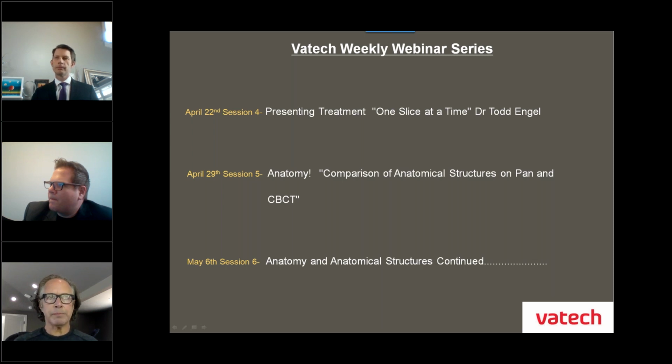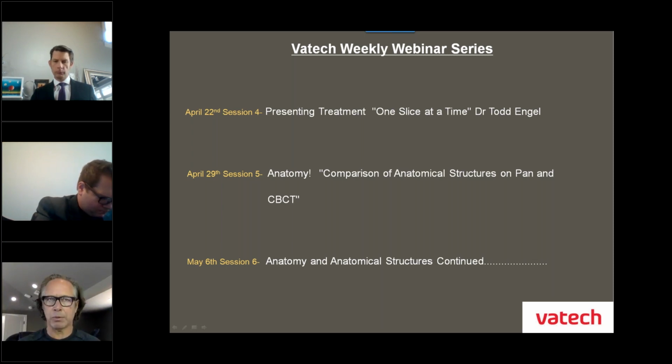All right, so take it piece by piece and understand that it is a language and it takes a long time to master it. As you see Jim and Paul click buttons and go back and forth, these guys do it every single day for many, many years. So don't let it intimidate you. Just hop in, knowing that you're going to use it for the fundamental sound features initially, and then, just like anything else you learned over time, start adding your flavor and coloring it in your own way. I think it's a really good approach.